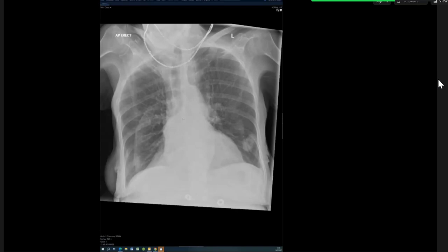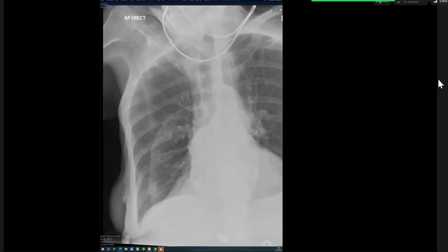So once you've picked a central increased density, the first thought is, is it just a hiatal hernia? Yeah, but you can see that the density is higher here than it is here. So there's something going on here. So once you've picked that, you need to think, if it's a tumor or something in the middle, it would be causing something. So I'm going to look here, there, all sides, and then you would see this triangle. Yeah, it's a typical appearance of a central mass causing a peripheral collapse. If I didn't have this, it would be a better X-ray. Sometimes I put this up like that just to see if they can pick it, but then it's a very big hint that I'm trying to show something here.